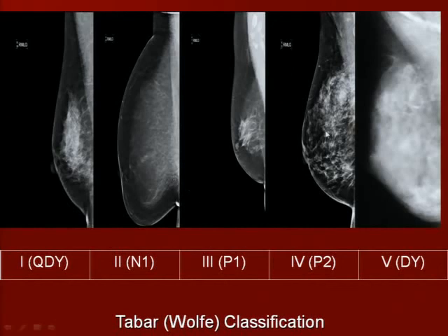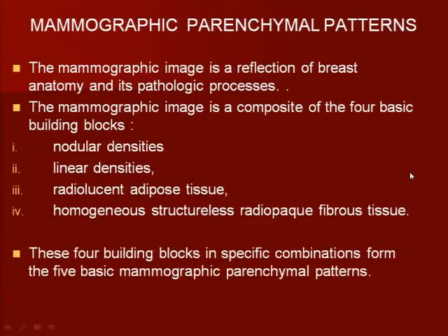Now 4 is more like nodular. You see little nodules, it's more of a nodular breast. And as I told you, what looks like nodules? The terminal ductal lobular units, the little units, they are the ones who look like nodules. If they grow bigger, you can get all kinds of adenosis, microcystic disease, fibroadenomatoid formation and things like that. And then we have the last breast that all of us hate. It's just homogeneously dense and it's structureless.